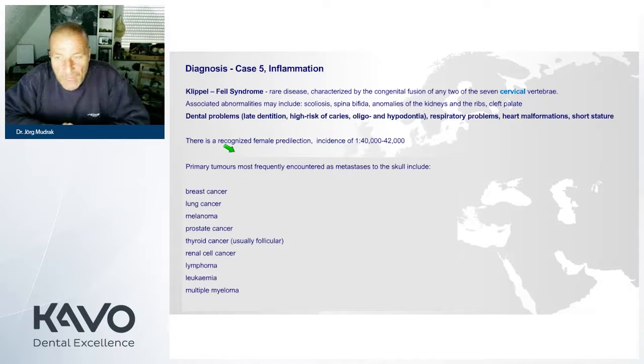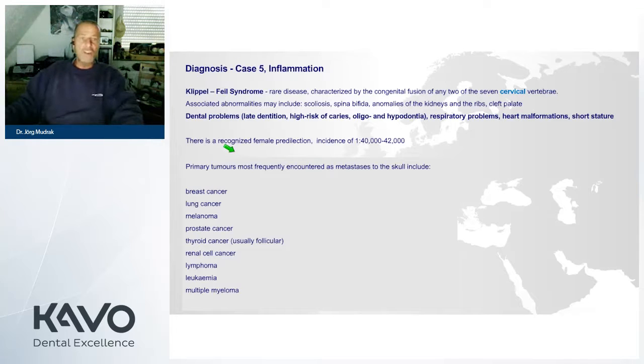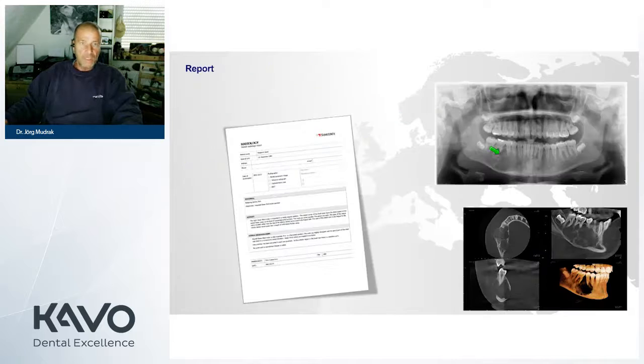As I would like to point out again, there are many more variations in the patients, of course. They are human beings, and there is a lot of variation, but we have to look at the whole image and not just focus on one area where we think that we are at home, which is our convenience zone. If we find something, we always have to look at the complete patient and not only focus on one single issue.